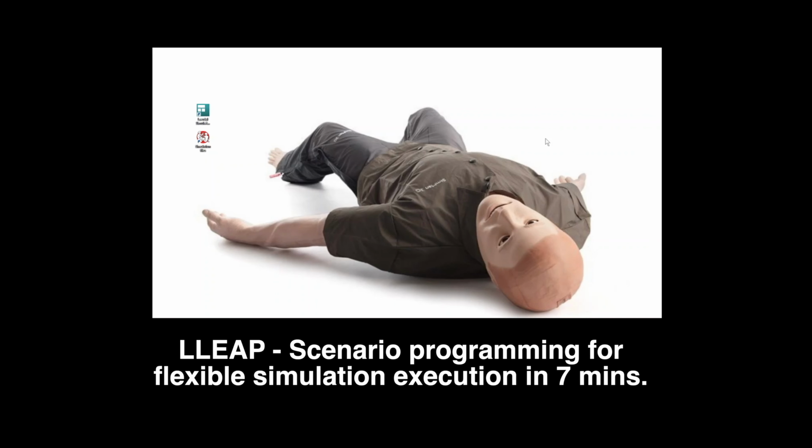LLEAP Scenario Programming for Flexible Simulation Execution in 7 minutes. The following video is dedicated to healthcare simulation enthusiasts who need to program and execute simulation training. It shares a LLEAP mannequin scenario programming method that can be a solution to your simulation execution.